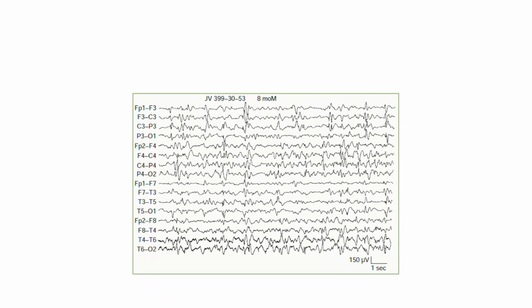This tracing displays one of the most striking and ominous patterns in clinical electroencephalography, hypsarrhythmia. While the previous EEGs we looked at had clear structural organization, either bursting simultaneously or localizing to a single focus, this recording demonstrates total cortical chaos.